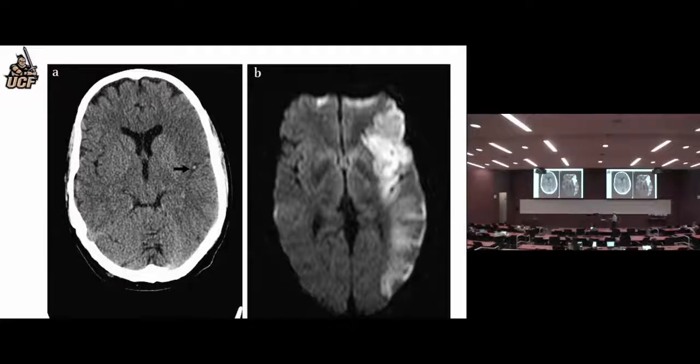But then there's something else which you occasionally see, and this is really interesting. See that little dot there? That is most likely a branch of the middle cerebral artery with a clot in it, and you're seeing the clot. It is interesting that you can sometimes see the clot itself. Could this be a fleck of calcium? Sure, it could be. But here, this is the right side of the picture, left side of the brain, so the right side of the person. So he's got a stroke, with sudden weakness on his right. This looks a little less dense. There's this little thing here which looks very much like it could be an artery that's plugged up. There's a really, really good chance that even without going to an MRI scan, that's a middle cerebral artery infarct.